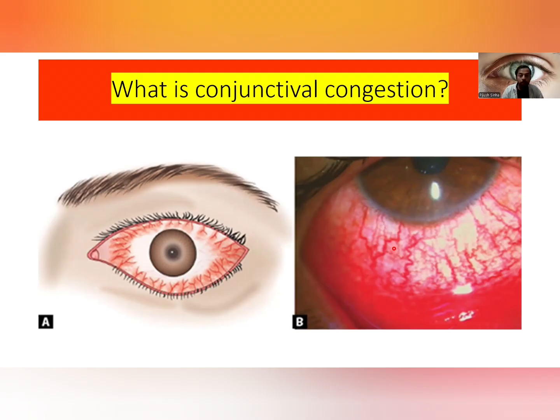And if you apply a vasoconstrictor drop like phenylephrine, the blood vessels will get constricted, and because of that the redness actually reduces. This happens in conjunctival congestion. So let's see some cases or clinical pictures of conjunctival congestion to understand it very nicely.